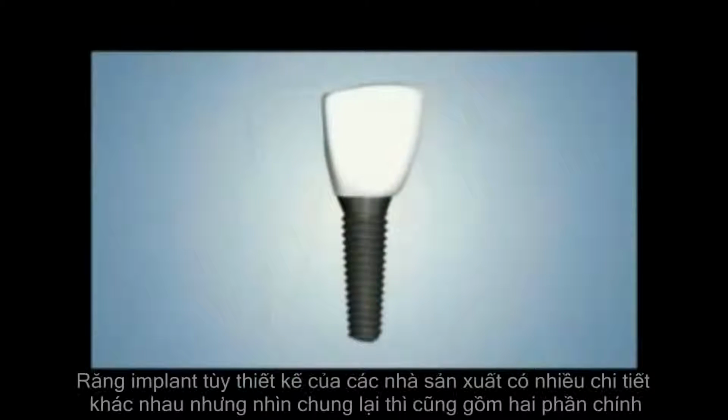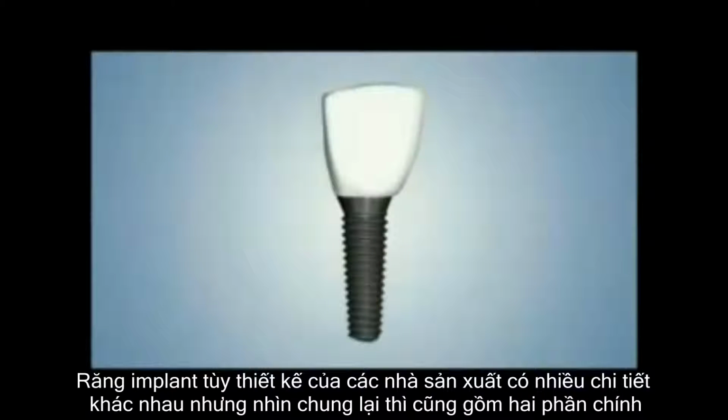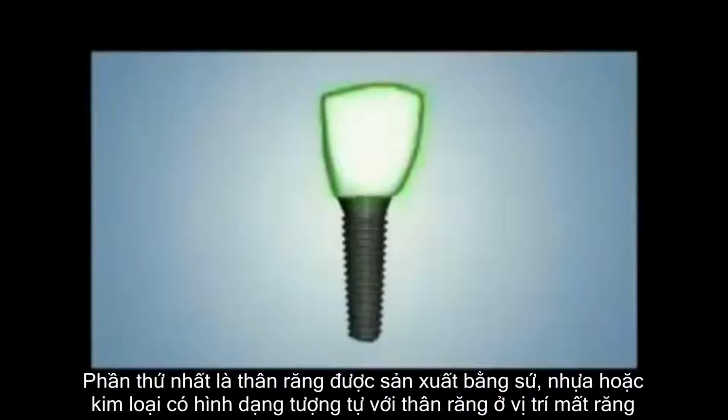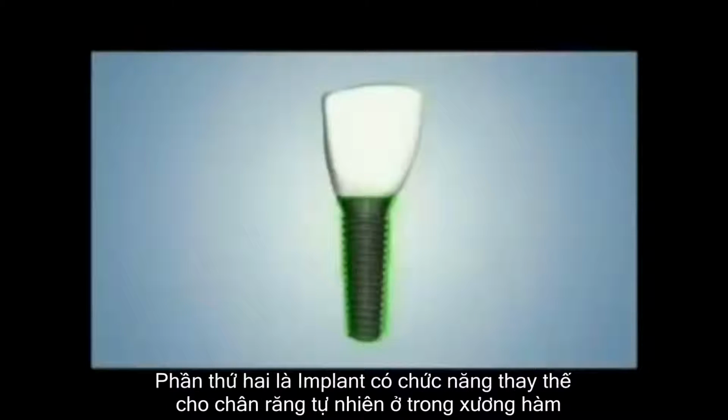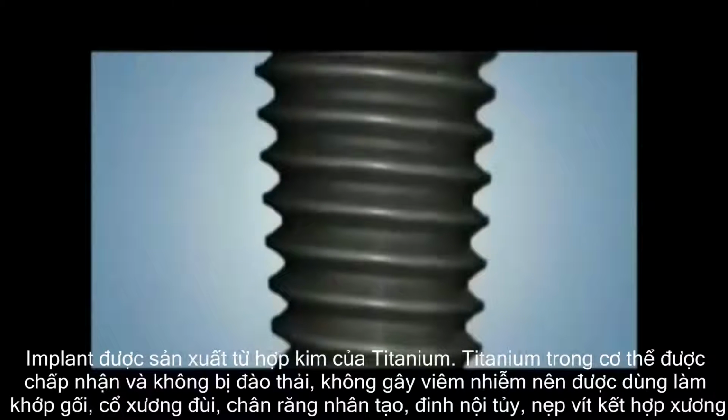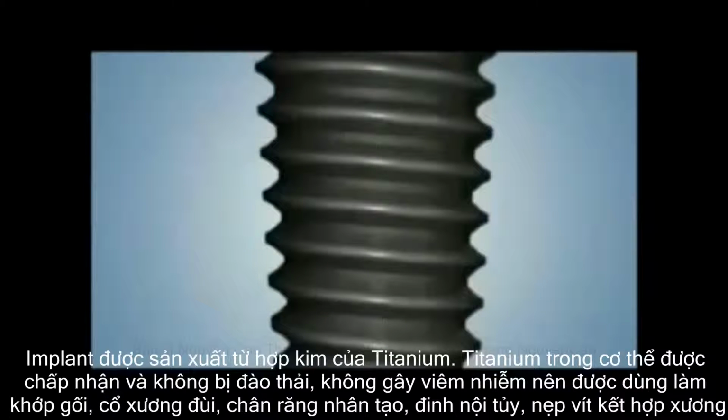A dental implant treatment may involve several pieces. However, it may also be described as having 2 main parts. One part is a restoration that is custom fabricated to match the shape of a natural tooth crown. The second part is the implant that replaces the function of a natural tooth root. Implants are made of titanium or titanium alloy. Unlike most materials, our body normally accepts titanium without infection.